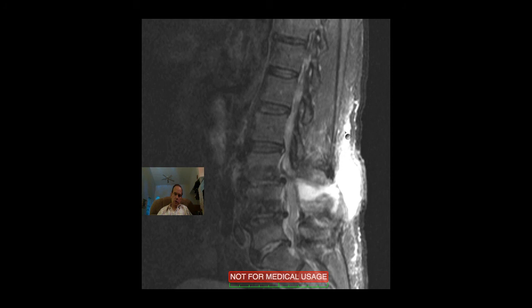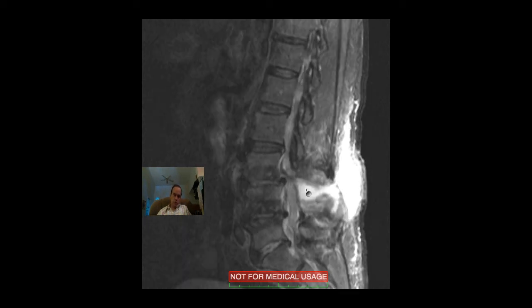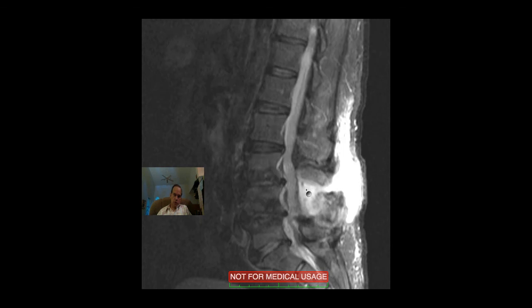So what we have here is this area where the surgery was done, and they went in and did a laminotomy. They went in and did a laminotomy here, and an infection developed in the bone and subcutaneous tissues, and so this actually is all abscess. So that's a pretty severe, serious complication from surgery. Fortunately, it's rare. Here again you see L3, L4, L5 with the endplate degenerative changes.